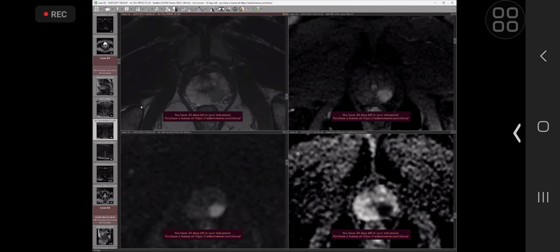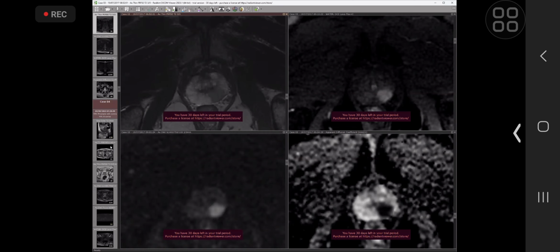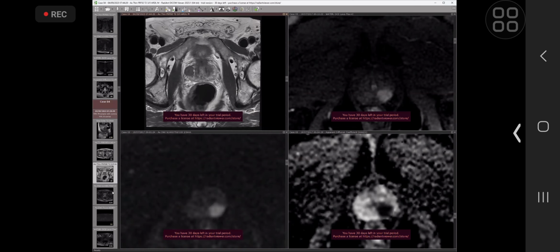Okay, that's that case. Thank you. We're going to go straight on to another case if we've got candidate 4 ready. So case 4 we're going to do now. So this is, let me load up for you, and I'm going to load, actually, let's load all the sequences so they're ready for you.